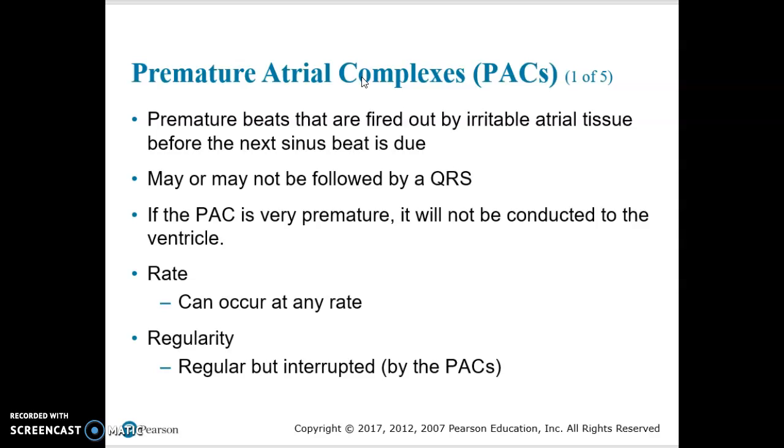These may or may not be followed by a QRS. It depends on how premature the PAC actually is. If the PAC is very premature, it will not be conducted to the ventricle, because it will arrive during the ventricle's refractory period, where it can't take anything else. So try to make sure that you understand that. If it's very early, that ventricle's already busy. It's in that refractory period and it can't take any other activity, so in this case it won't be followed by the QRS.